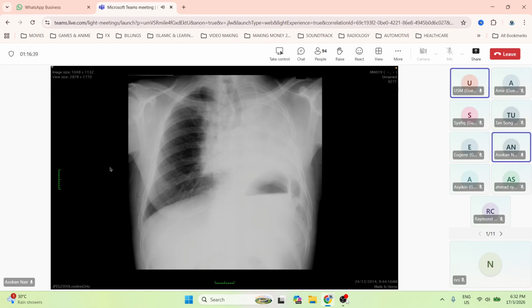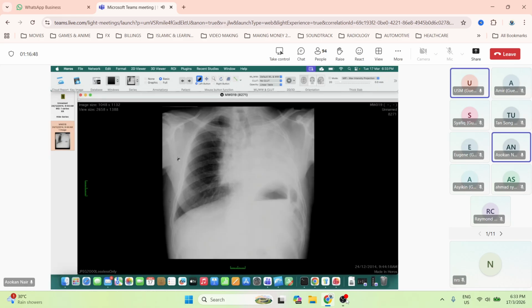All right. So remember, if you see this appearance with one rib missing, the patient has had a pneumonectomy. Okay. So complete whiteout, a few things. If this is a huge effusion, then you get mediastinal shift, right? You won't get loss of volume like this.